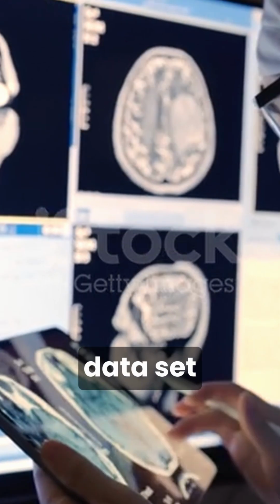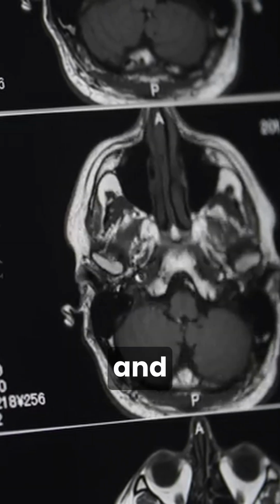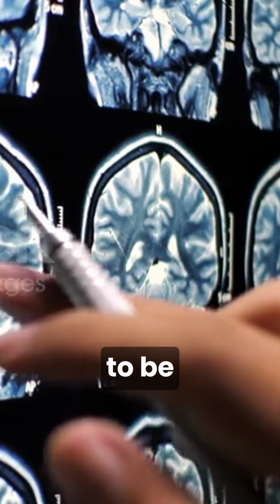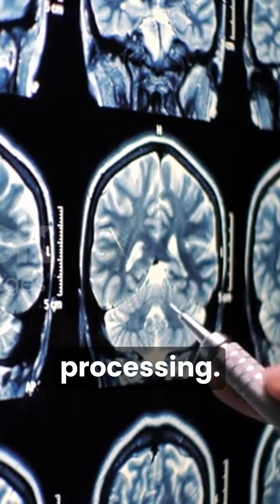We begin with a dataset of MRI brain scans from Kaggle. These images contain vital information and are segregated into two subfolders containing brain tumor MRI scans and ones without tumor, but they need processing to be useful for our machine learning model. The first step is pre-processing.